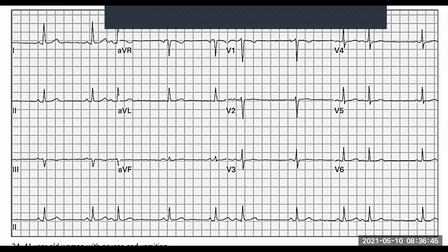Now let's look at the groupings, all right? So remember, we're trying to see, are the groupings regular? And it doesn't take a rocket scientist to see, no, they're not regular, all right? But there is a little pattern that's emerging over here. So you notice we've got 1, 1, 2, 1, 1, 2, 1, 1, 2, 1, right? When you really look at it. So that means we are getting a regular, irregular rhythm. All right, so that's what you call a regular, irregular rhythm.